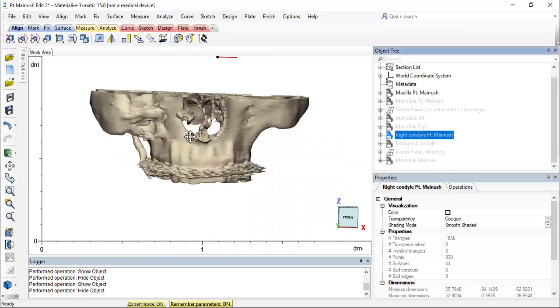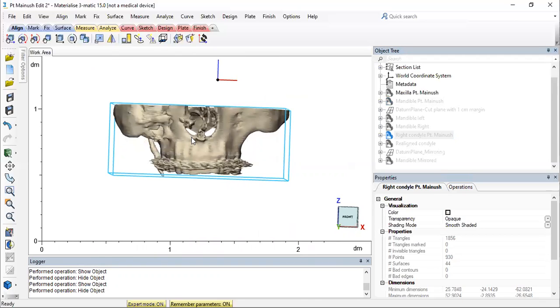In case the condyle is not preserved for the diseased anatomy section also, we'll first incorporate the cut section of the condyle from the healthy anatomy. Then, based on the mandible, we'll try and replace it, realigning it with the defected side.